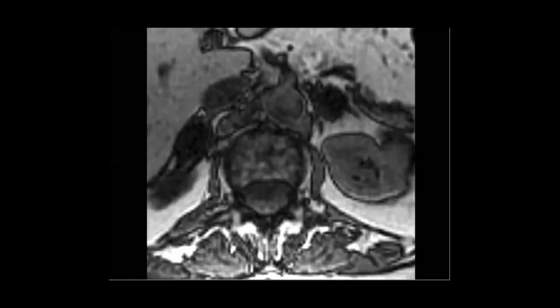So everyone can see the feedback of the exam now from Ines. They have some fractures, something in the renal, FNH. What else, Ines? Mesothelioma, left cardiac myxoma, silicon granuloma.